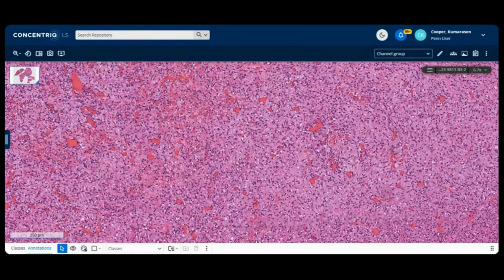But believe me, they do have a heterogeneous morphology, and you have to just be thinking about it with the monotony, like Sheena mentioned earlier on. When she said translocation associated tumors, they tend to have this monotonous cytology, uniform monotonous cytology. And if you think about fusion related tumors, they typically do have that kind of pattern, which makes you think about these fusion related tumors.